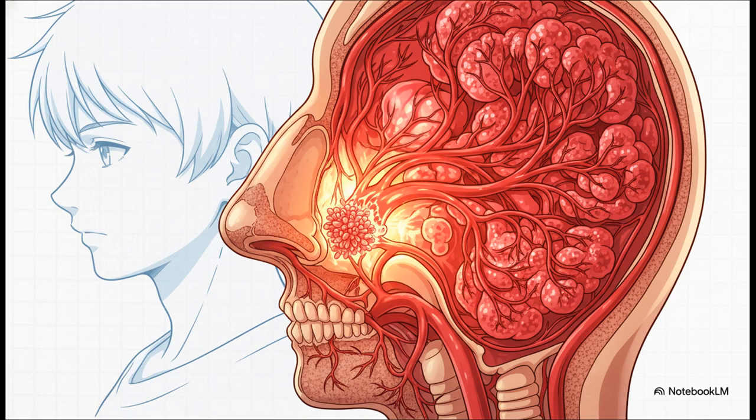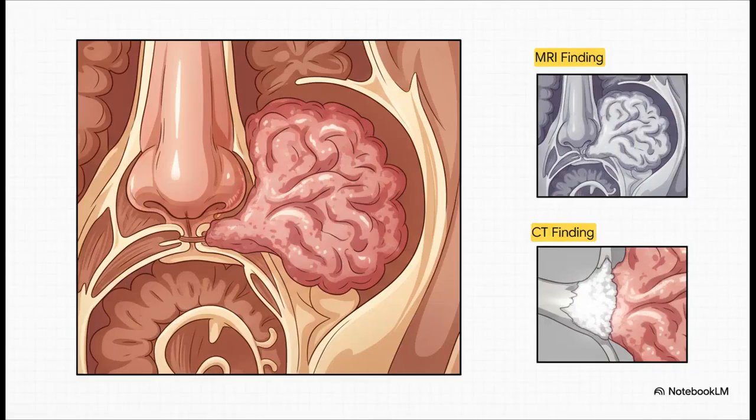It has a classic starting point right at the sphenopalatine foramen, and when you give contrast, this thing will light up like a light bulb. Okay, next up is the inverted papilloma. This one is tricky. It's a bit of a wolf in sheep's clothing.